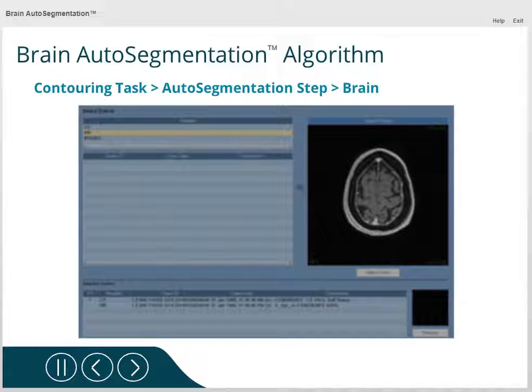Let's get started with the process. We begin by selecting our patient and select Standard Plan. Load the desired datasets, specifically the two required, which include the primary CT and the T1 weighted MR. If other secondary datasets are desired for other purposes, we need to bring them in now. A maximum of 3 MR datasets can be loaded, fused, and available for planning purposes.